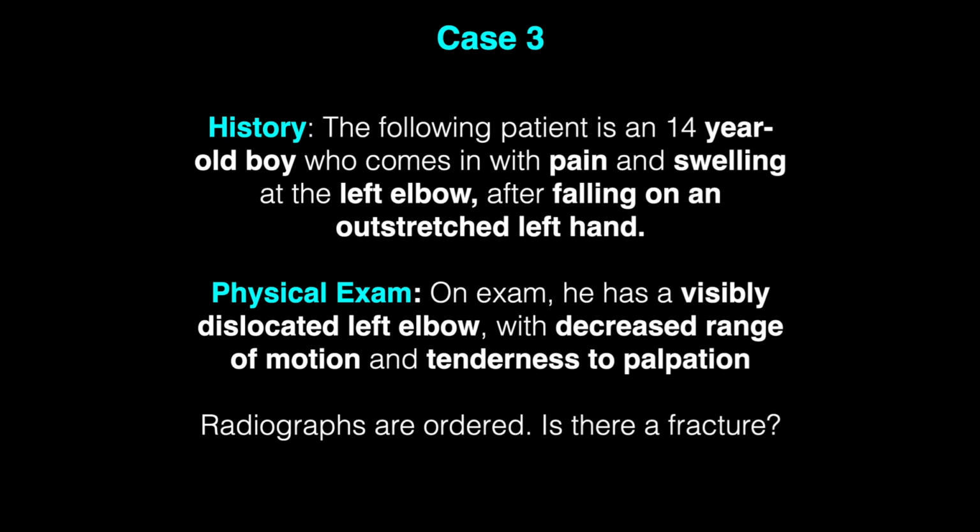Let's do a case now. The following patient is a 14-year-old boy who comes in with pain and swelling of the left elbow after falling on an outstretched left hand. On exam, he has a visibly dislocated left elbow with decreased range of motion and tenderness to palpation. Radiographs are ordered. Is there a fracture?